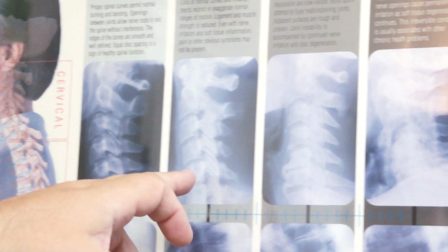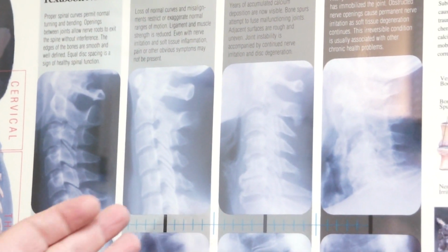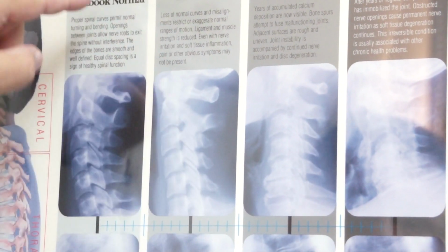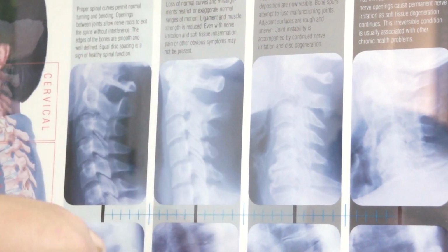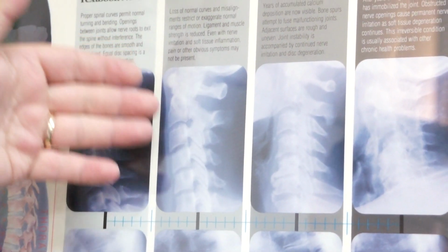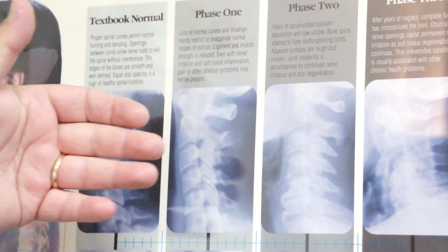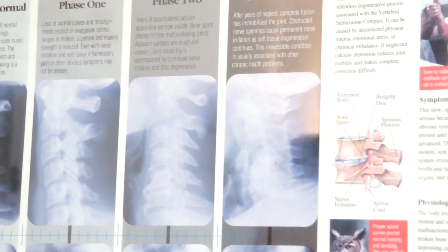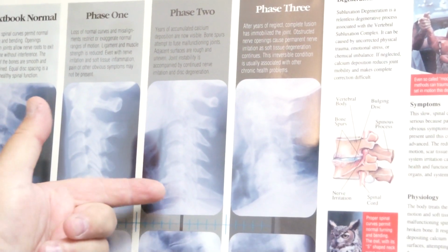In this view, this is what we consider forward head posture. There's no degeneration in this person at this time, but the curve is reversed. It narrows the canal, and the disc space in this particular case is totally normal. But if it's left like this for 12 to 15 years, over time the spine will degenerate and you'll develop osteoarthritis, usually at C5, C6.